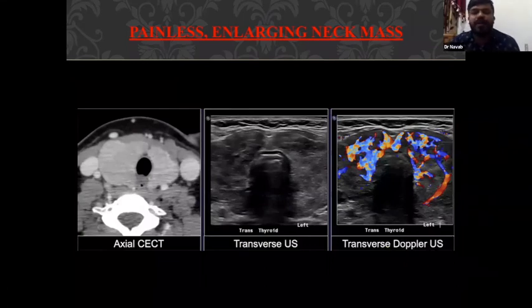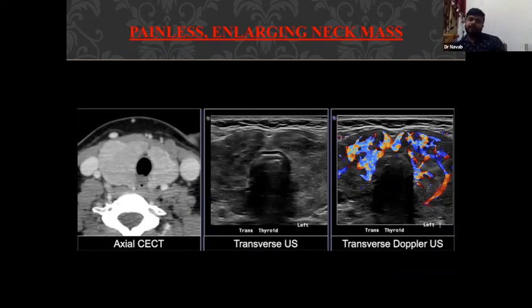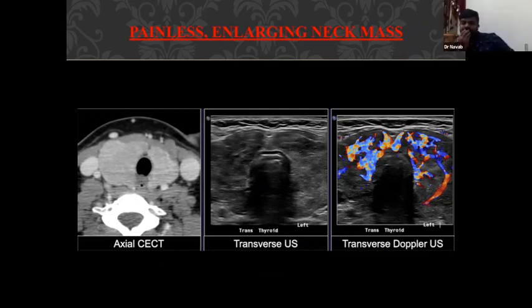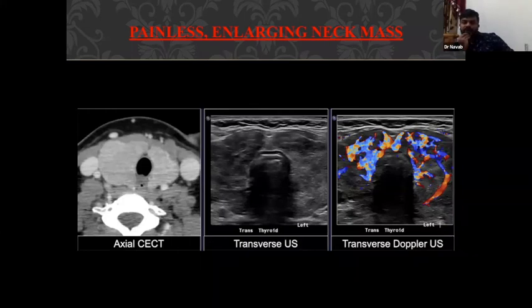This is a very common case we are seeing, right? I'm seeing an enlarged thyroid, and in the ultrasound images there is heterogeneous echotexture of the thyroid with increased vascularity, possibly a case of thyroiditis. Okay, what is that heterogeneity? Can you describe that? Coarse echotexture. But you can see some micro nodules, right? Tiny micro nodules. Then what are the other findings you are seeing? Can you see that white fibrous stranding? You can see that, right?